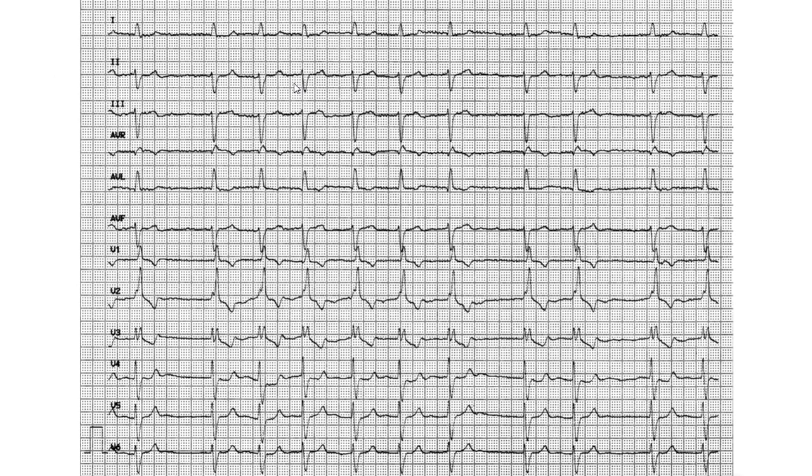Clearly irregular. And what about point 2? P waves or not? Do you see any P waves? You go through all of it. This is question 29, by the way. And you can pause whenever you like just to think about it more. You can even use V1 to help you with the P wave idea, of course. And I don't see any P waves. So it's irregular. I don't see P waves, and that's enough for me to say that it is atrial fibrillation.